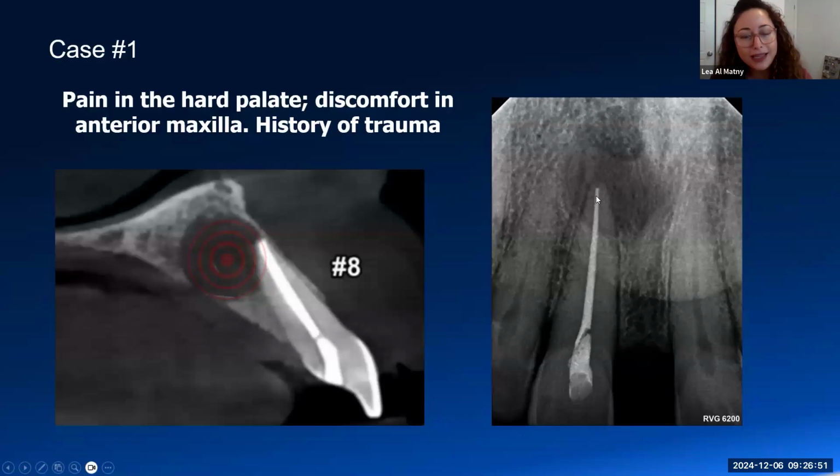But if we try to make the same diagnosis on periapical X-ray, you'll see that it can be a bit more misleading, and it can be easier to assume this is a lesion of endodontic origin because both epicenters are aligned on top of each other. You have that circular shape, low in density, and it does look like it's surrounding the apex. So this is one thing where diagnosing with CBCT can be more accurate compared to periapical x-rays.